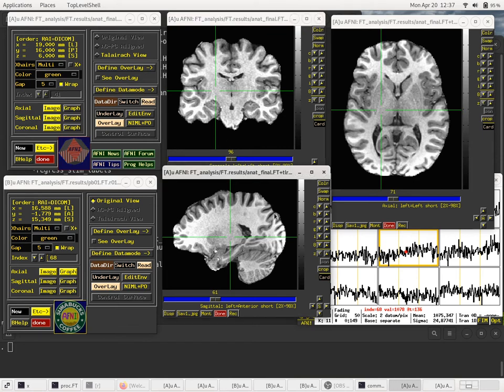So, for example, in the sagittal image here, we've got the CSF following the gray matter down in this little curve here. If we toggle the underlay to be the EPI, we should see a bright pattern matching that, because the most bright part of the EPI image is the CSF, and CSF is dark in the T1, so the dark anatomy should register with the bright EPI, and you can see that looks really good there.